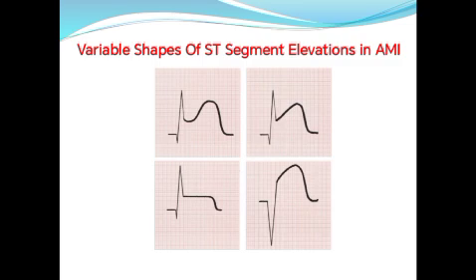Okay, here are some variable shapes, or different shapes, of ST segment elevation that occur in the setting of acute myocardial infarction.